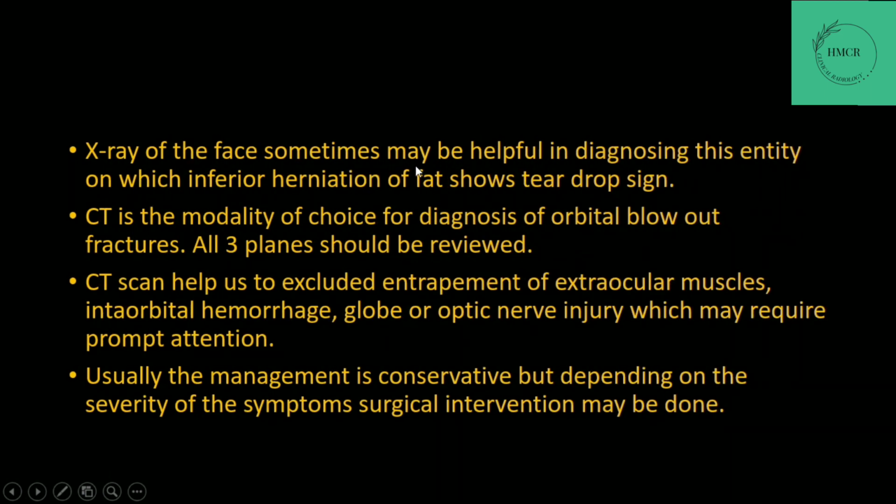X-ray of the face sometimes may be helpful in diagnosing this entity, on which inferior herniation of fat shows teardrop sign. CT is the modality of choice for diagnosis of orbital blowout fractures. All three planes should be reviewed.